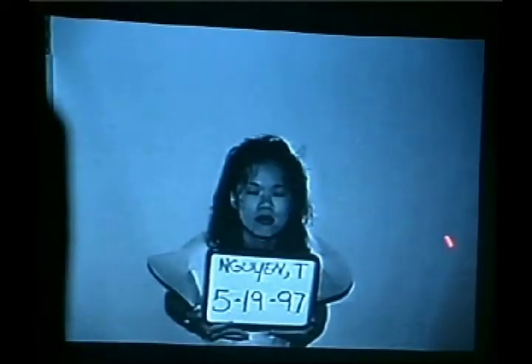Now here, the reason I want this up here, this is 1997. This was actually the unit Dr. Croft used to refer his patients to in the early 80s. It's called a video fluoroscopy machine. And that's not what we do, but let me show you.